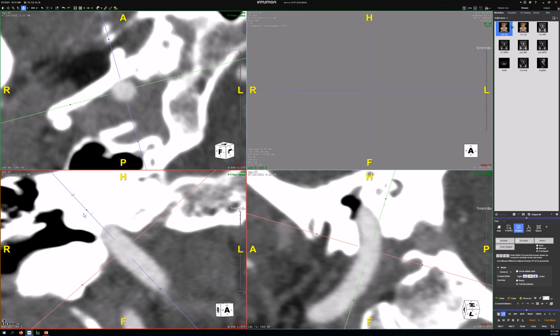I don't understand how much I'm supposed to rotate counterclockwise. Well, here in this person, it's an oval, not a circle, in cross section at this point. And I'm going to show you how to segment that right now. This will be the long axis, and you want it to be perpendicular to the long axis. So we found the cross section of the vessel.